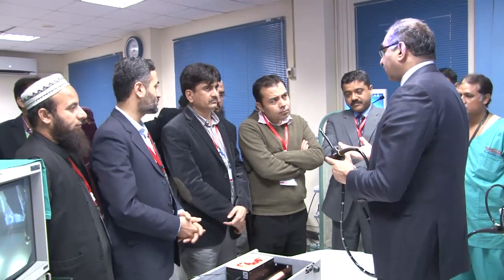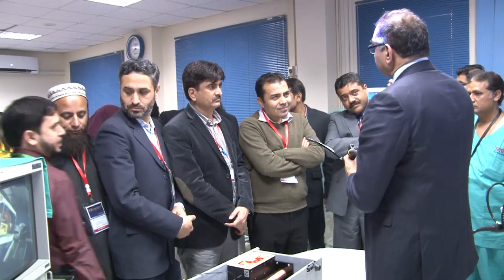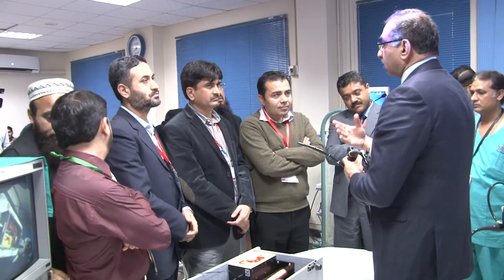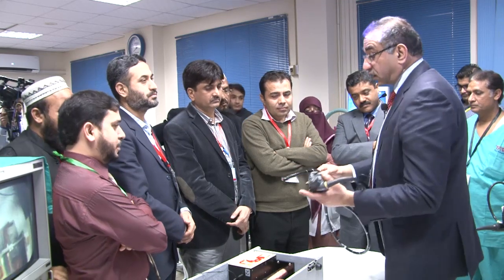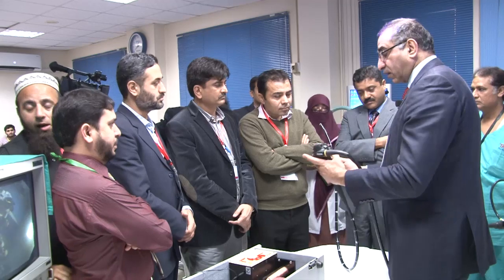So whenever I teach my registrar, I always tell them that it's like learning to drive a car, watching through your side window, not through the front windscreen, right? It's always a different orientation when you are going through the various structures, right? So first of all, you need to familiarize yourself with the scope.